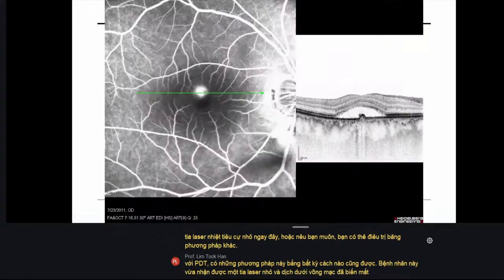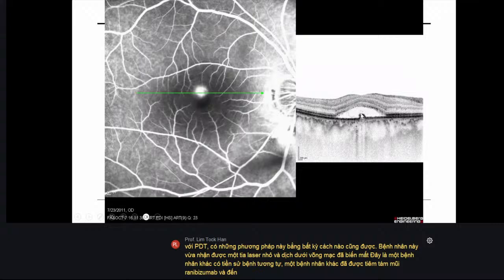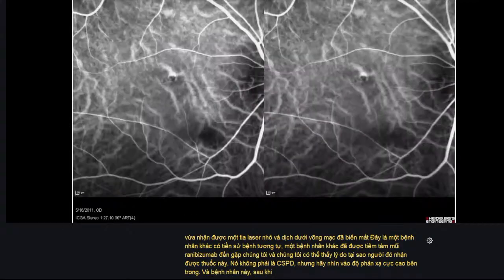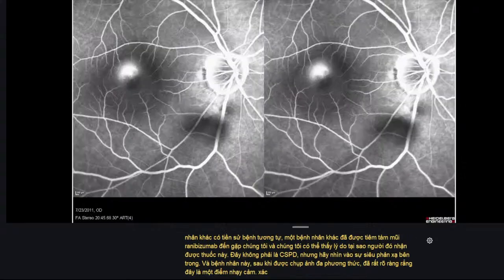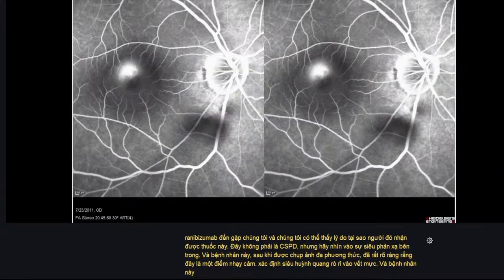This is another patient that has a similar case history. Another patient who has received 8 ranibizumab injections came to see us, and we can see why the person received this, because of this PED. It's not a serious PED, but look at this internal hyperreflectivity. And after multimodal imaging, it's amply clear that this is a spot of pinpoint hyperfluorescence that leaks into an ink blot. And this patient just received PDT and the lesion resolved.